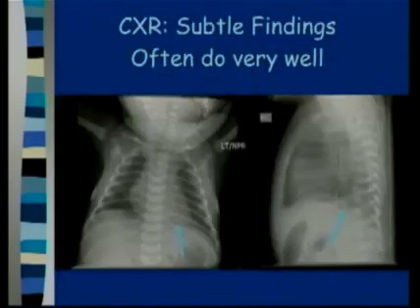And this is the chest x-ray on this fetus after birth. Actually, now it's a neonate. And you can see the chest, the heart here, and there's really very little on the x-ray to see. Here you can see just a little bit of the stranding. Very subtle findings for this patient with a cystic adenomatoid malformation.